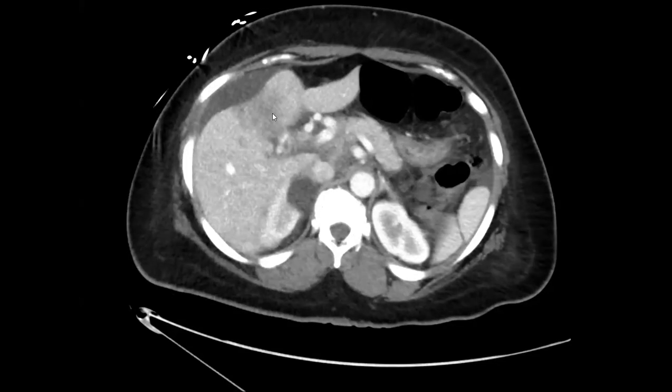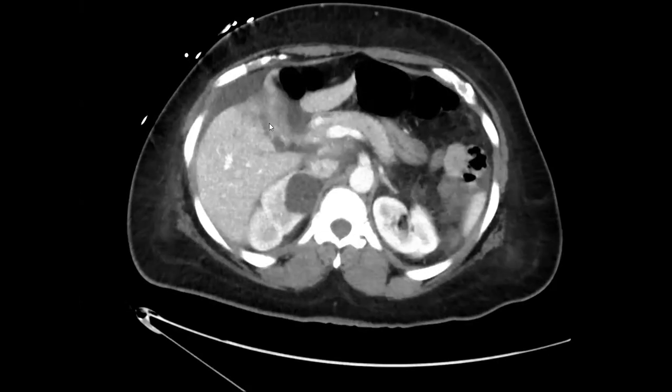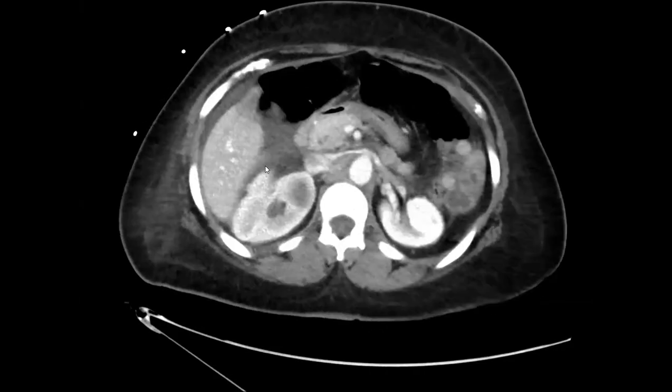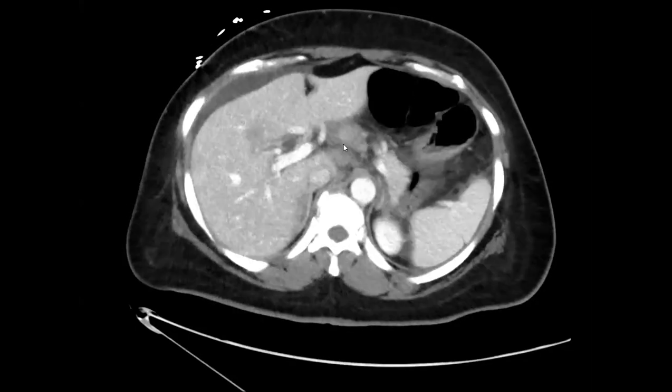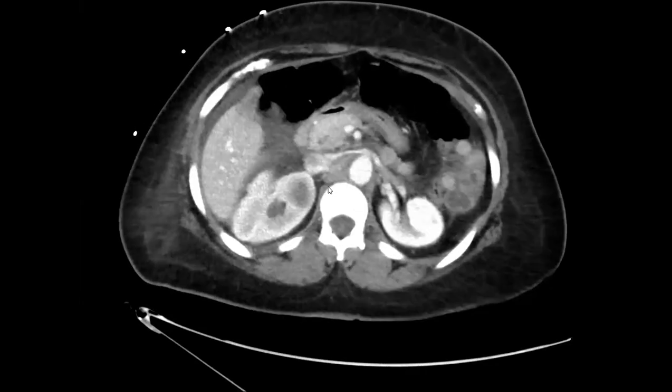So basically, it was a gallbladder cancer spread directly into the liver, which it likes to do because it doesn't have a good capsule, and the veins and lymphatics drain directly into the liver. It was causing that capsular retraction. And then there's also actually all of these lymph nodes up here. And then it was causing ovarian mets too.